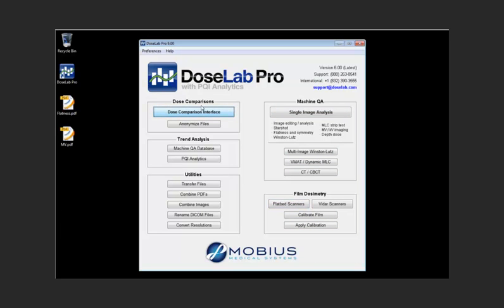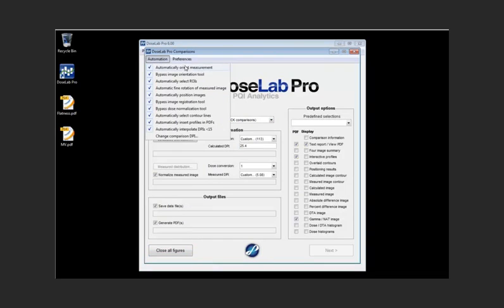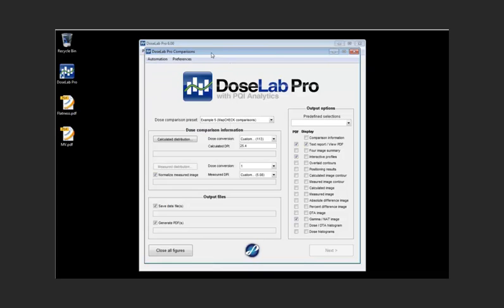After we've converted our film to dose, we can use DoseLab's automatic comparisons to analyze them. In this case, I'm just going to show what MapCHECK comparisons look like. We have an automation menu, so we can do as little or as much of these steps manually as we would like, and we'll change our output options to the batch comparison preset.